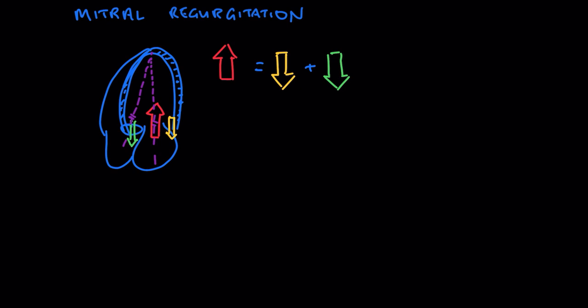So at the mitral valve, we'll see a signal like this. And this is the inflow. This is blood coming into the left ventricle. You'll note, unlike the aortic valve, it's two different peaks. There's the E wave and the A wave, and we'll take the area right under here to get a VTI. Let's say that that is 12 centimeters. That's our VTI. I didn't draw the regurgitant flow here.